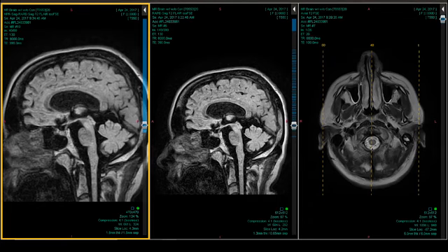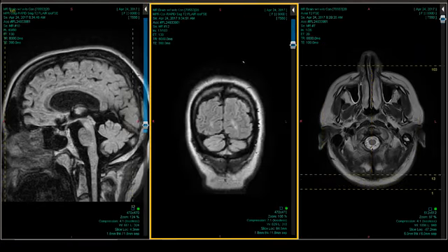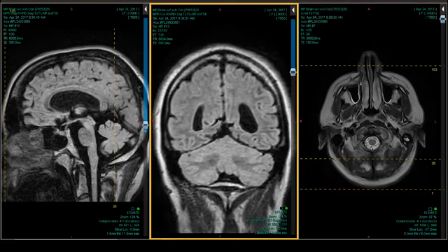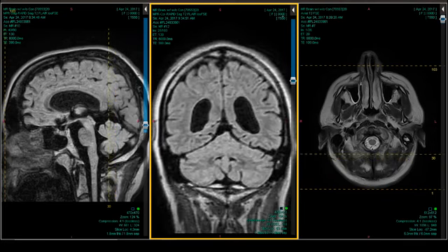And let's keep looking. Let's look at the coronal. Now, when you really get thin slices with overlap, you can click this button and you can reformat, and we may do that a little bit later, but in the interest of time, not now.